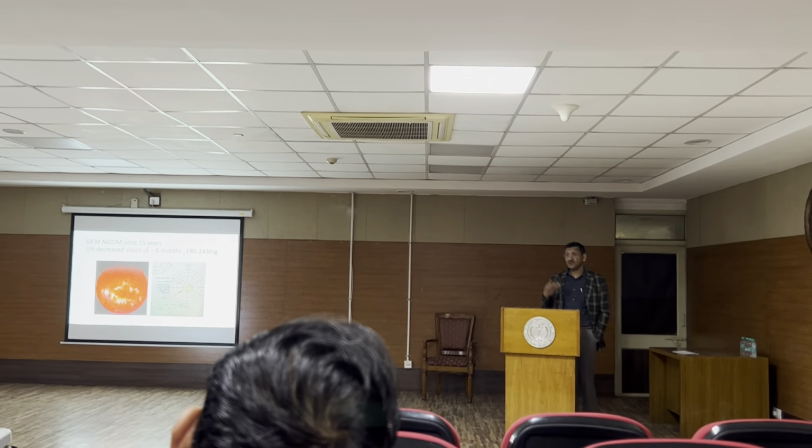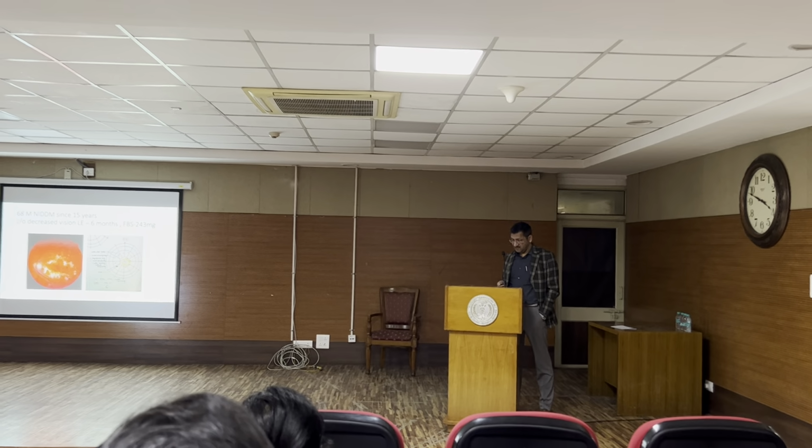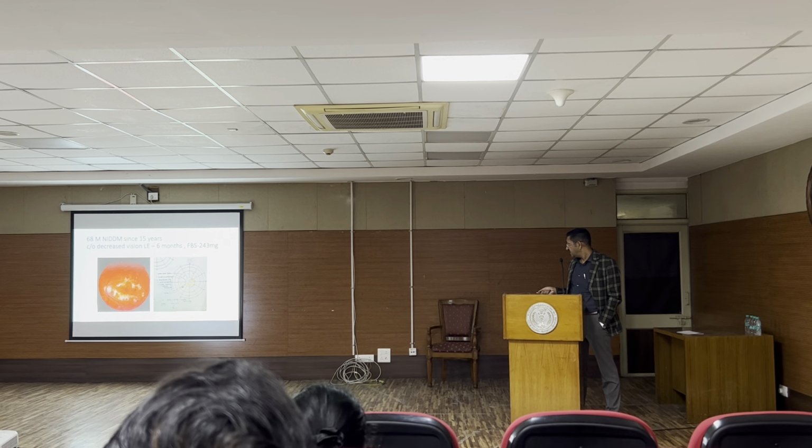Then the next question the examiner will ask you, now tell me what is your diagnosis. Time does not permit an interactive session, so I'll ask myself and answer myself the possible questions. If I'm asked what is the diagnosis, my diagnosis would be, sir, this is a case of left eye proliferative diabetic retinopathy with diabetic macular edema, right?